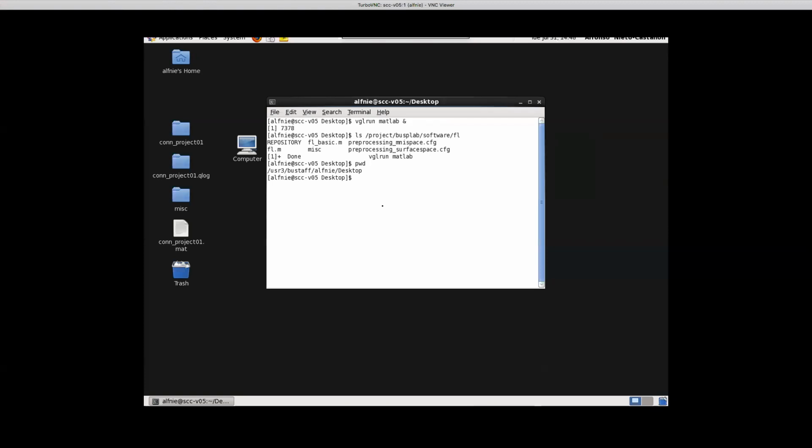I don't know. Why would you want to have that? I could generate that intermediate step file if you want, but why would you want that? Yeah, I was just going to say, if you wanted to see where the functional activation results are compared to the gyri and sulci of an individual, not on an average surface.